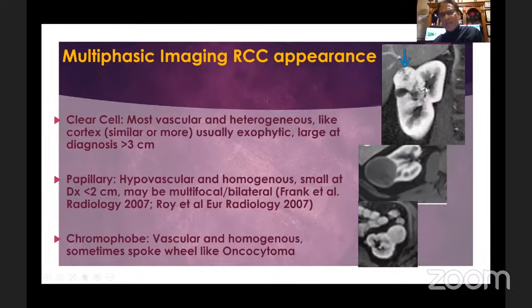This is partially exophytic, more than 3 centimeters at diagnosis, whereas papillary is relatively hypovascular. You need subtraction images to see the mild enhancement. It is fairly well defined. And chromophobe shows mild to moderate enhancement, well-defined, no necrosis within the lesion.